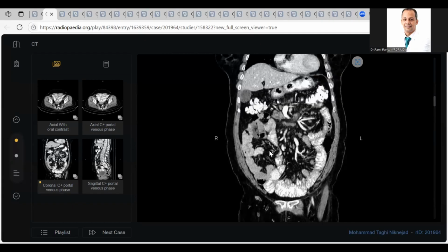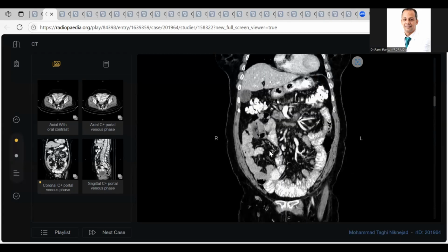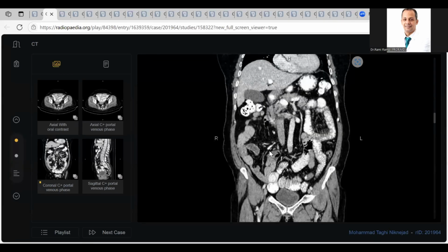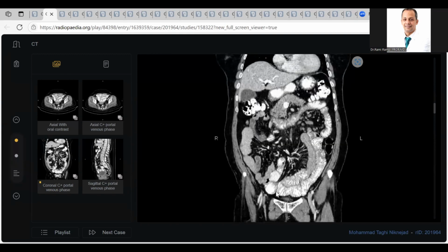Doctor, thank you. You did very well, except one point. This case is to be smashed within 1.5 minutes, 2 minutes maximum. You should pick up the findings from the beginning and shift without my asking. Either you ask me for the coronal to confirm.